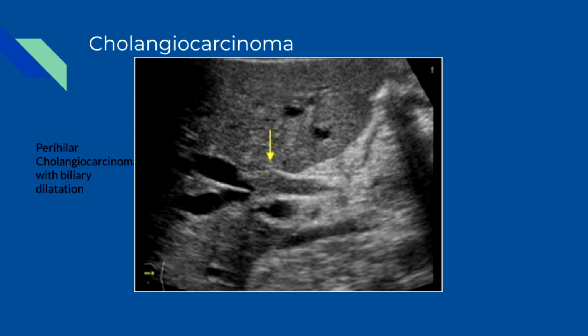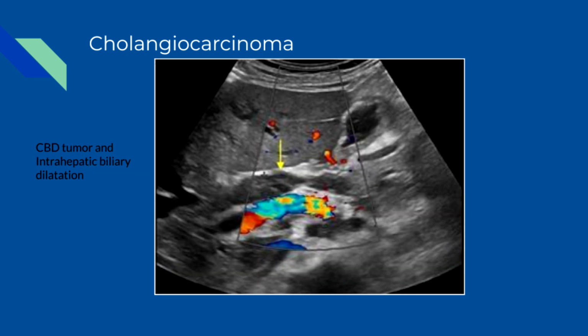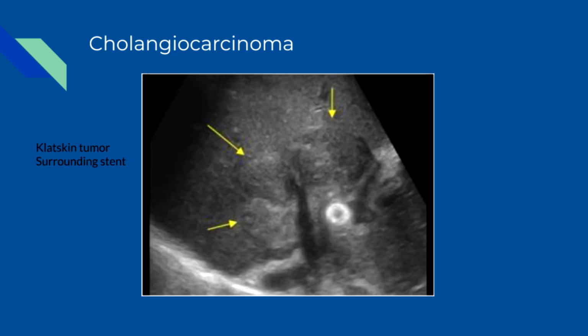Sonographically, the most common finding in patients with cholangiocarcinoma is biliary dilatation. Papillary tumors resemble polypoid intraluminal masses. Nodular cholangiocarcinoma manifests as a discrete smooth mass associated with wall thickening. Infiltrating cholangiocarcinoma is the most common type, but it is difficult to evaluate with sonography.